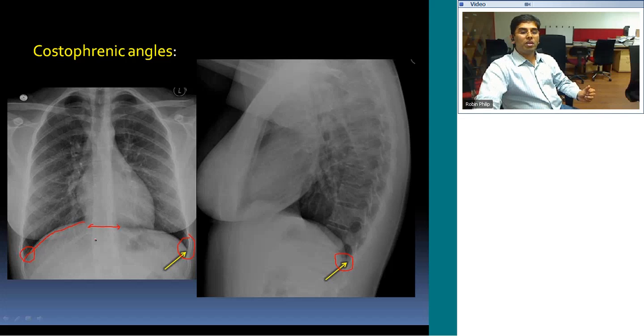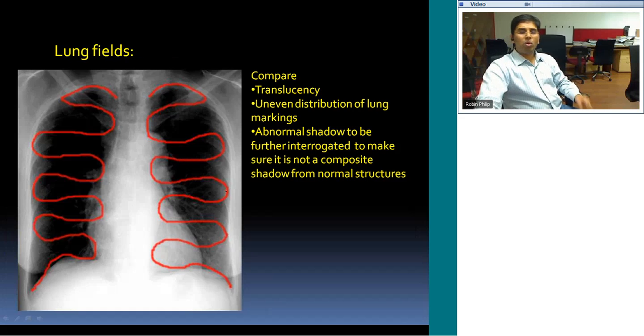the liver that is located in the right upper quadrant pushes the right hemidiaphragm. That's not true. It's mainly because of the heart sitting and depressing the central portion of the diaphragm and the left portion. Then move on to the lung fields.